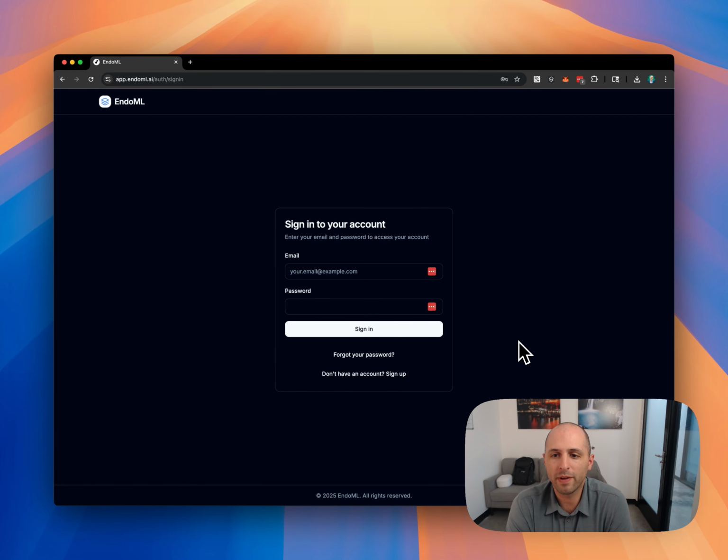I'm the CEO and founder of Virgo, and today I'll be giving you a quick demo of our new product, EndoML. EndoML is a platform that's designed to help any user, regardless of their background or experience with machine learning, to train their own AI models using their own data.